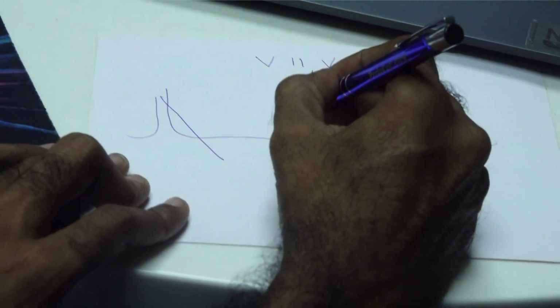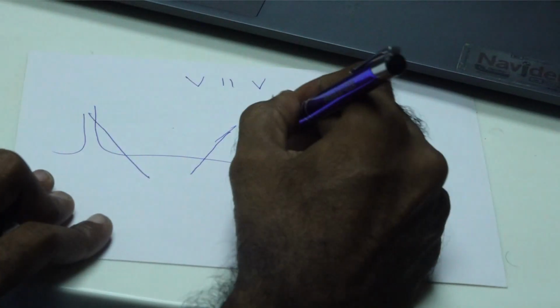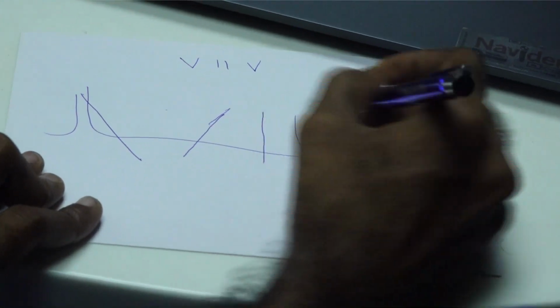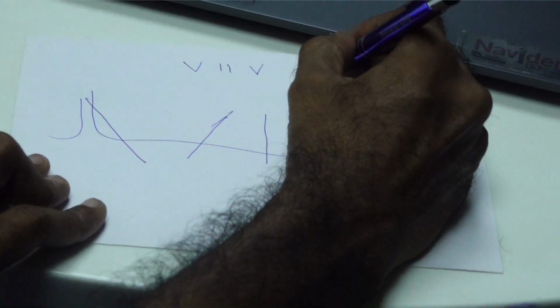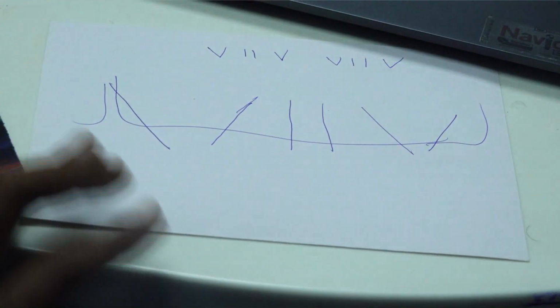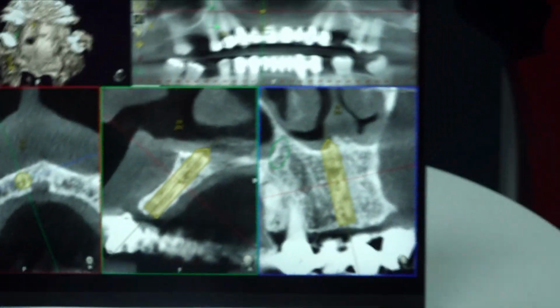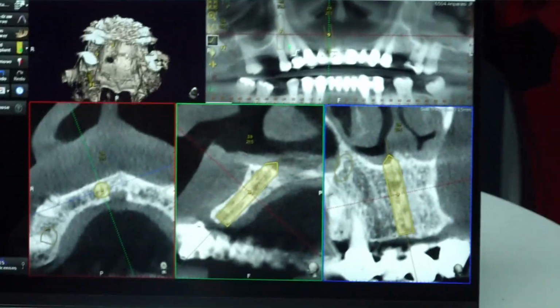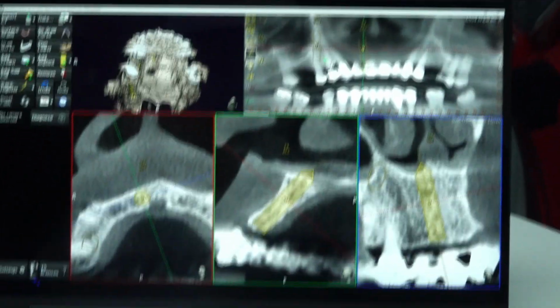This is this premolar, anterior to the premolar one tilted like this. One central incisor, another central incisor, another tilted, another tilted. So it will look like a V to V. Okay, no more implants are needed, provided they are good, long, in good bone, good diameter. This is more than enough. You don't have to be worried about anything.